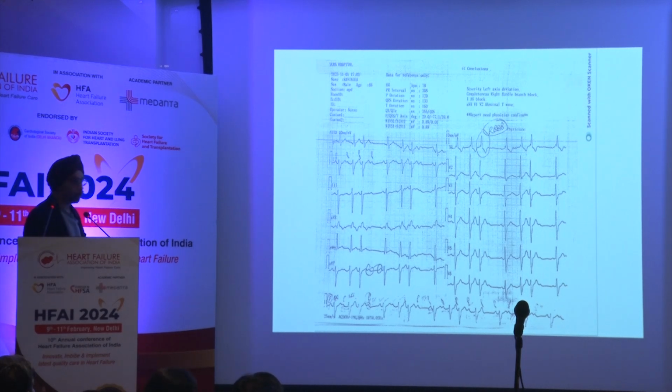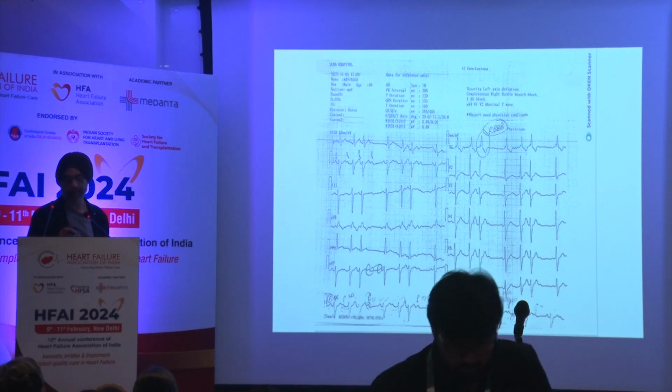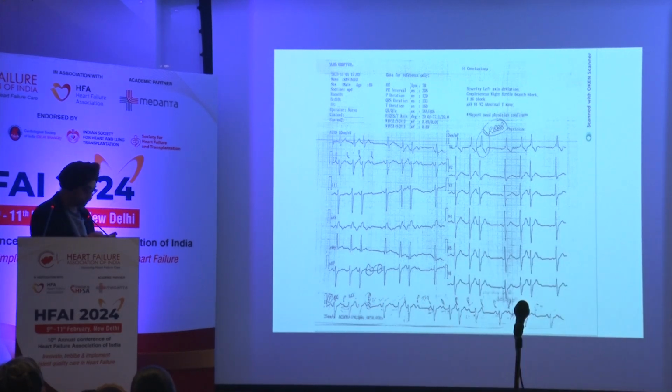So, all Wenckebachs do not mean AV nodal disease, do not mean innocuous disease. Look at the bundle branch block. Be careful if you have a Wenckebach with a bundle branch block. This is a high likelihood to go into a high grade AV block like this patient.